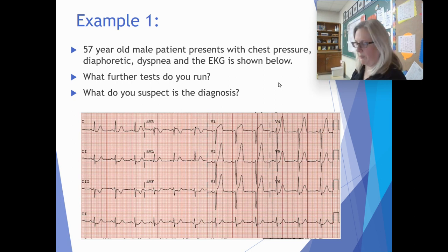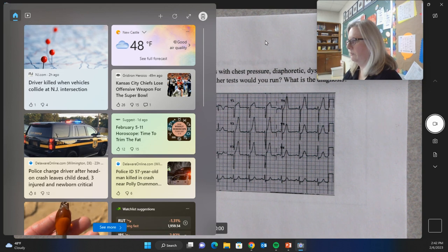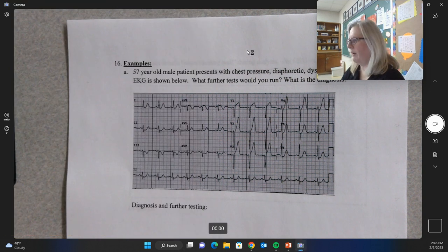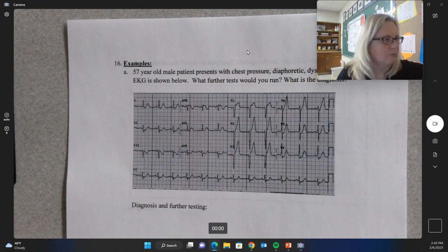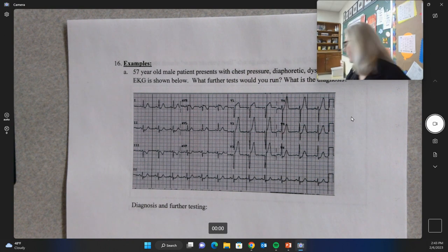AVL. I'm going to pop that over here. Let's do that. It's going to make it a little easier. All right, here's your example. Let me help you with this. I got other stuff starting. I'll just do what it's doing. All right, here we go.